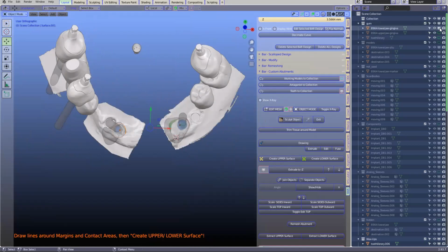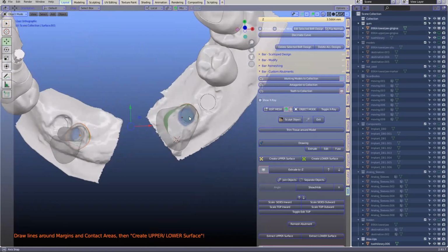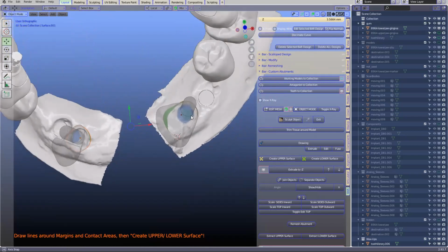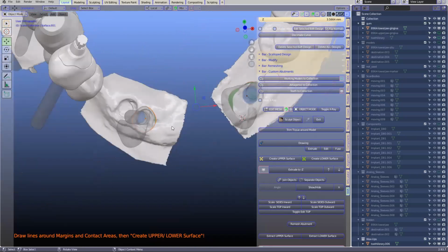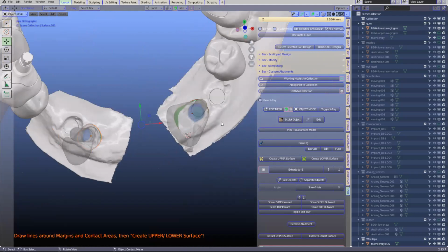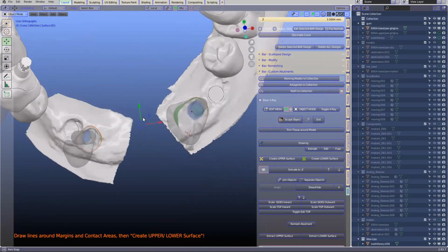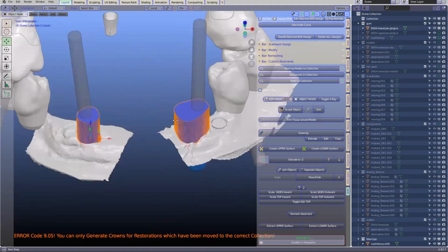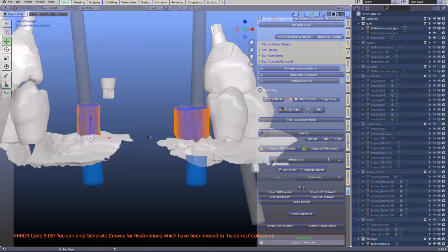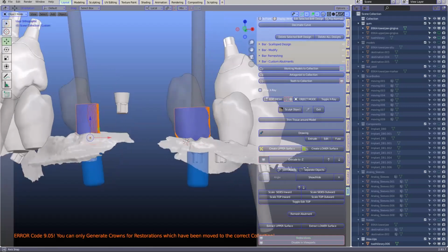Okay, well, we don't really have a model here. So we need to look at it. You see, here what happens is the tooth, it's quite tricky, isn't it, Wolf? Yeah, it is. You might even have to pull it over later when you finish the crown. So extrude like that. Let's just look at this. At least it's parallel.